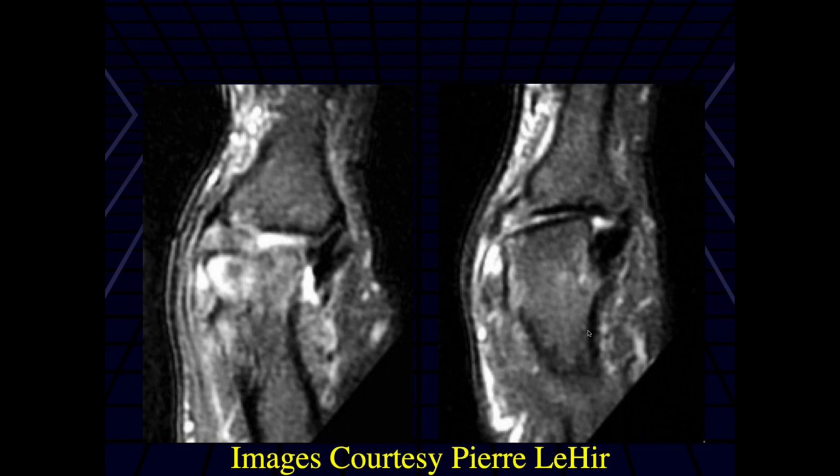Okay, we're seeing some edema on the ulnar side of the MCP. Yeah, lots of bone marrow edema there, the head of the MCP. Is it the phalanx that would be displaced? Yeah, so you're seeing that there's instability of the joint space here.